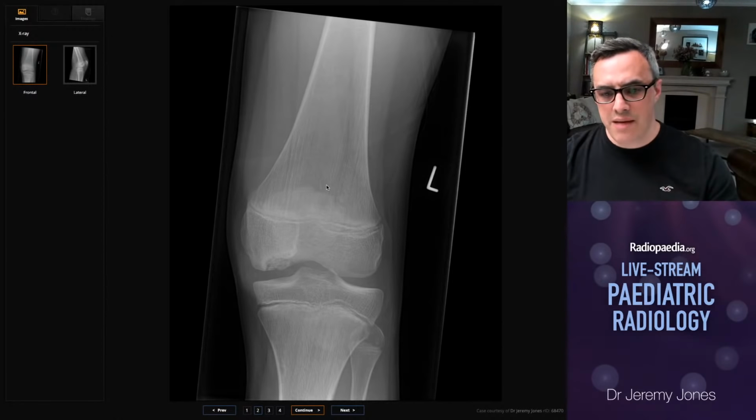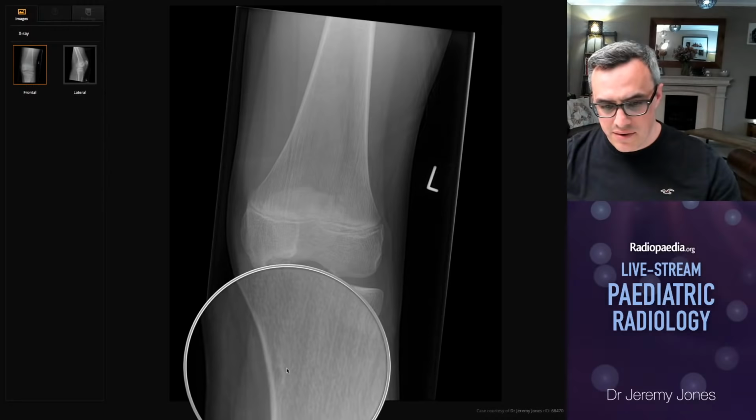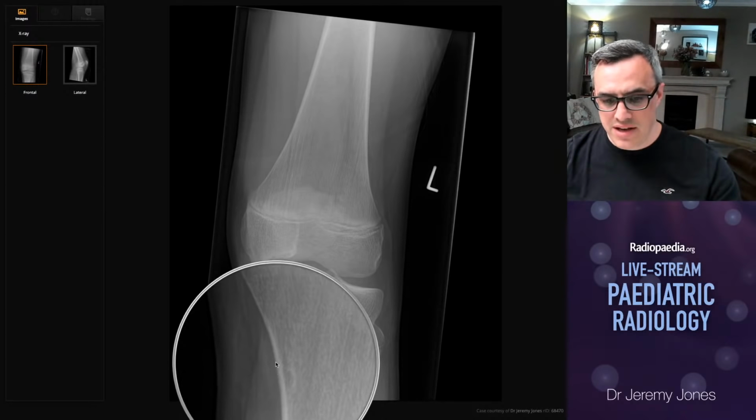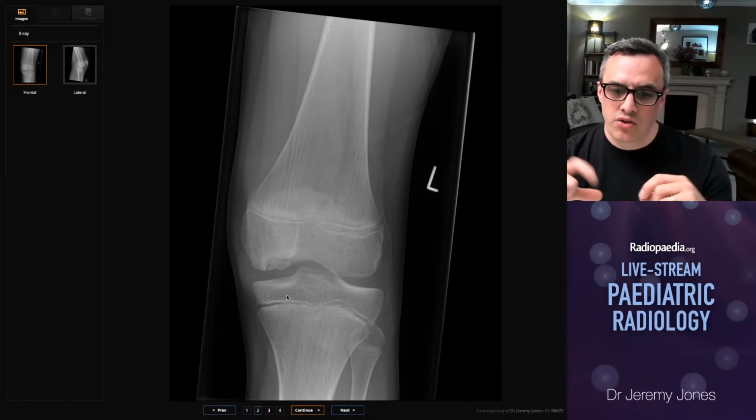So again, same things we're looking for. We're looking for patellar, we're looking at the physes. These are the things that freak people out if they're not looking at films regularly. This child has also got a little fibrous cortical defect in the same location as the last child. Remember that fibrocortical defects and non-ossifying fibromas are cousins of each other. It's just the size that's different.